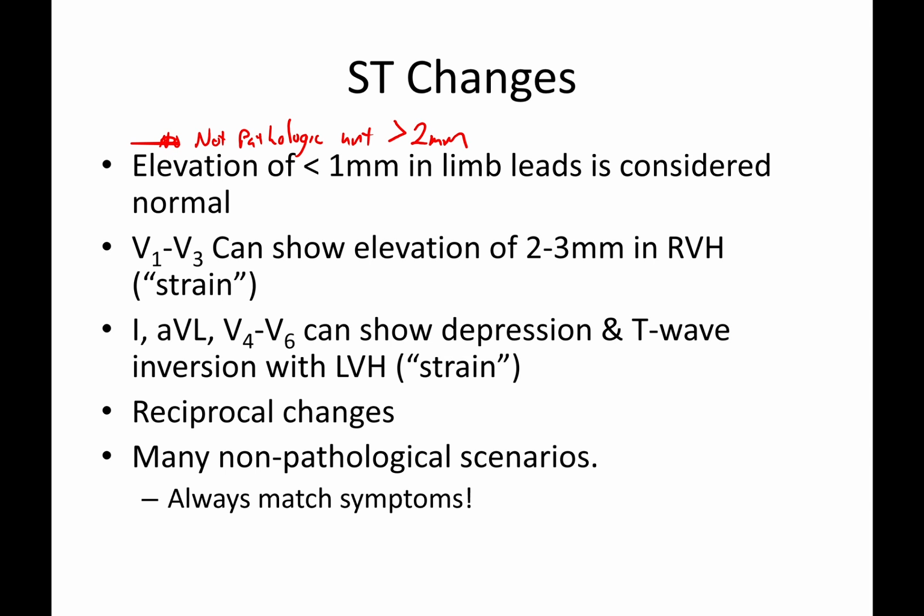You've probably heard that somewhere before. The truth of the matter is it's not that simple. And so I'm actually going to scratch all that out and say this instead. Elevation of less than 1 millimeter in your limb leads is considered normal. So you can have a little bit of variation there. If those get above 1 millimeter, something's probably going on.